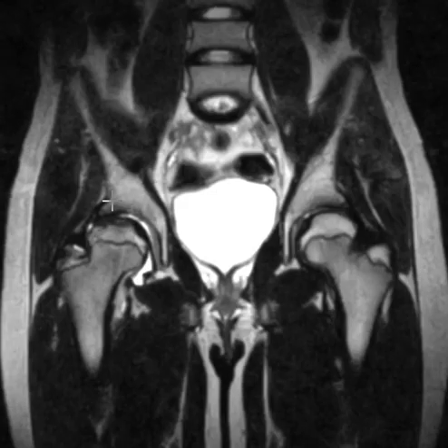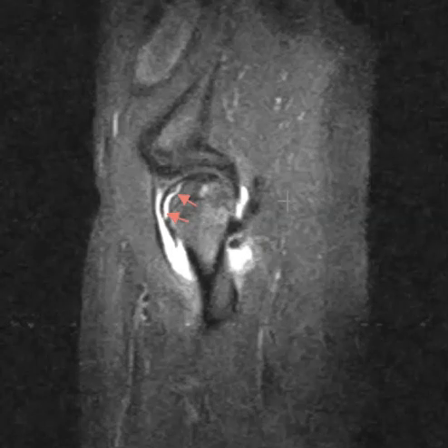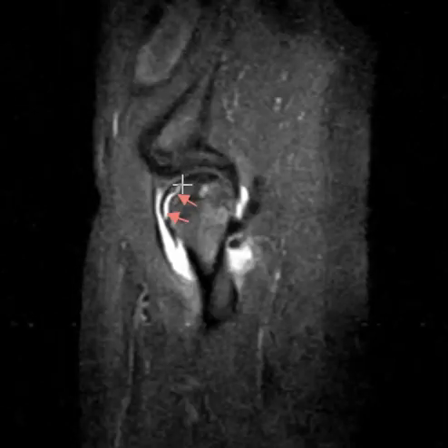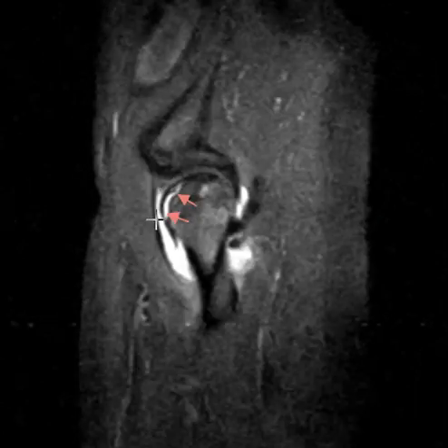Now there's one other very significant finding here. If we put up a sagittal view here, in this sagittal view, I put some arrows. This is towards the front, back, we see a line of fluid. Looks like this is the cortex or periosteum here over the top, and there is an abnormal band of fluid. So it looks like subperiosteal or subcortical hemorrhage underneath, uplifting the cortex there. This is fluid in the hip joint.